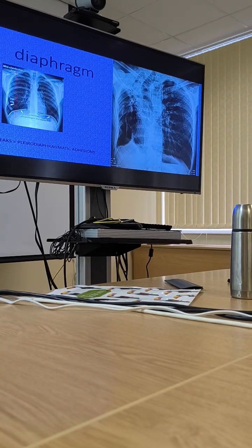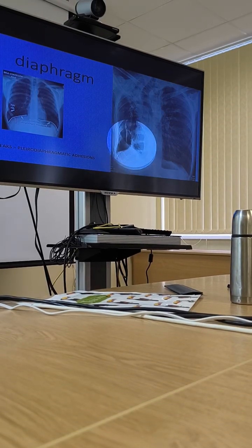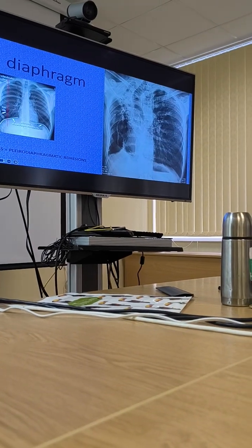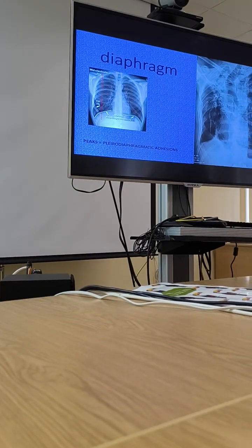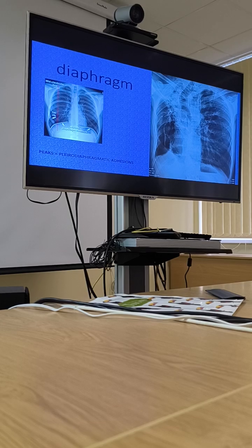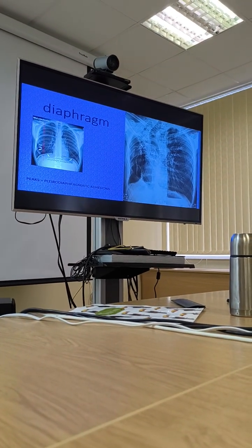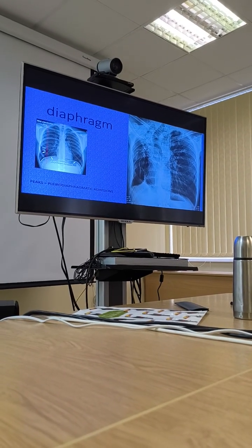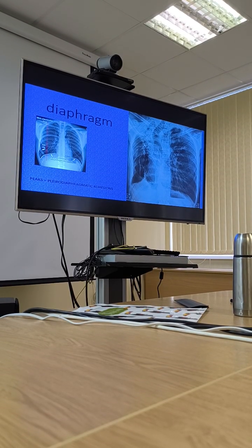So let's add something about the diaphragm. We already discussed this, who remembers what this is? Fibrosis. Juxtaphrenic peak, yes, fibrosis, you're right. Well, this is a sign of former inflammation, an operation or something. For example, in this situation, this is a patient who had part of the lung removed in previous years.